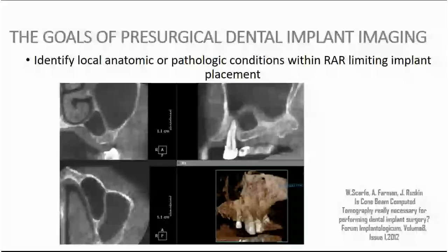carefully, because even if we go to a sinus lift procedure and to bone reconstruction procedure, we will be able to do just half of the procedure, and we should think about changing our plan and using that available bone, maybe using shorter implants, or using some additional tools which will help us to partially elevate the sinus membrane.